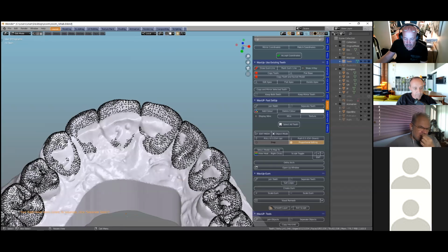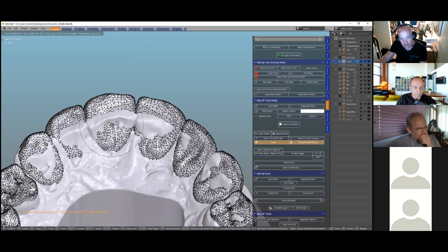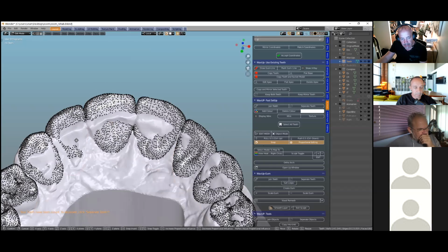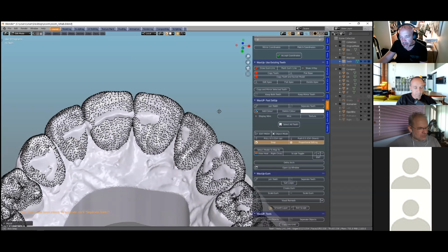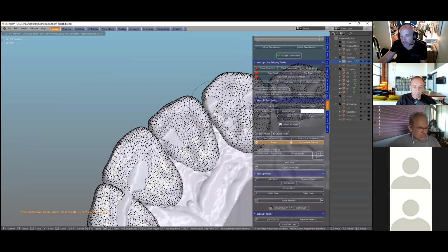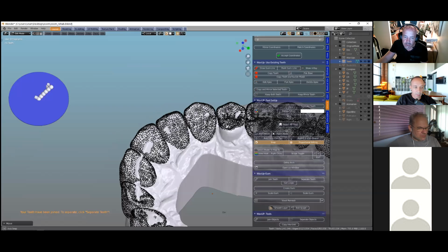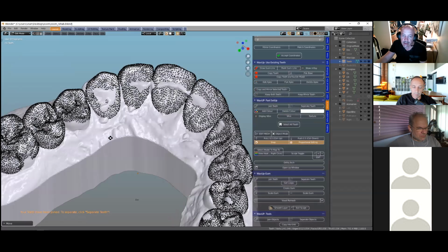So let's use the G key. If we go into Edit Mesh, we can use the G key, and then we can bring that mesh outwards, and it'll stick to that surface where we want it to stick. I'm just selecting, left click, and it'll adhere to the surface. So yeah. And then, of course, we may want to make temporary. So this needs to actually be quite a way thicker, all of this.